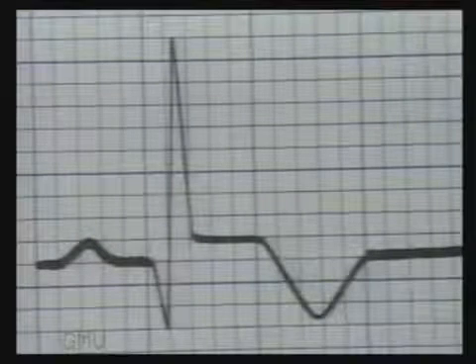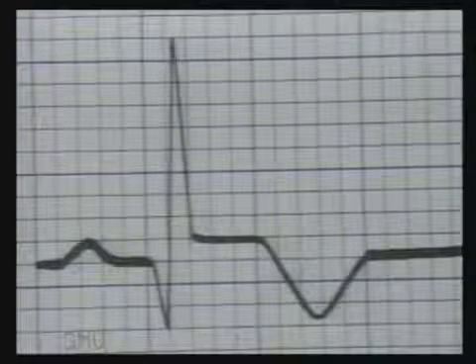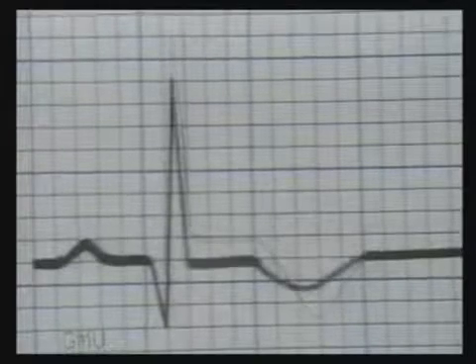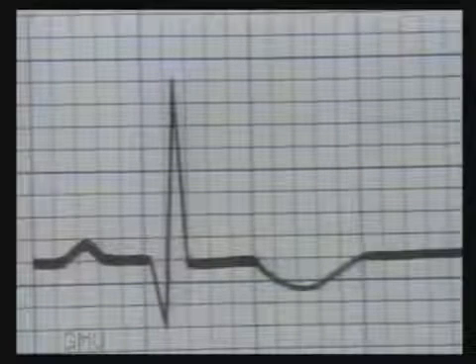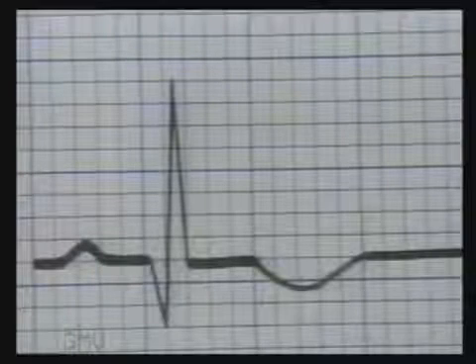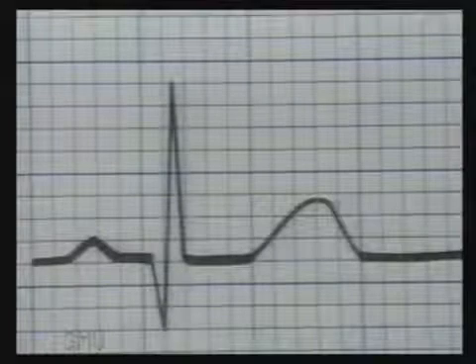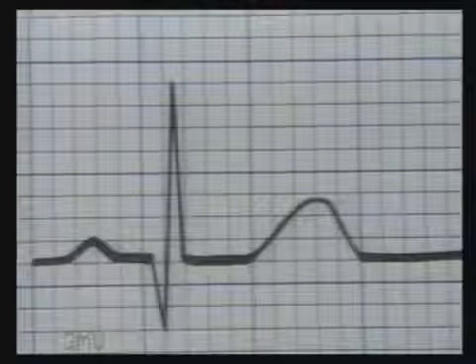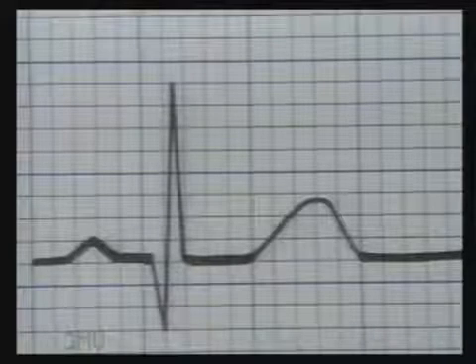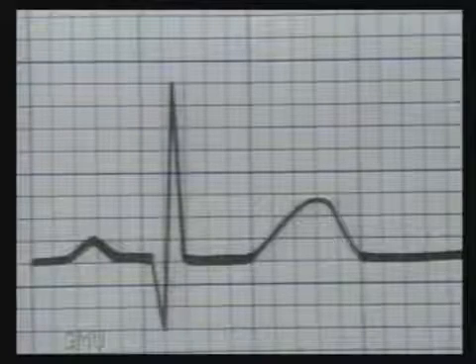The T wave is typically pointed and inverted with symmetrical limbs. In the third week, the Q wave will become fully developed and the T wave will gradually become flat and start returning to normal. By the end of the 3 months, the ST segment and T wave will return to normal and only the Q wave will remain permanent. Of course, if the size of the infarct is very small, the Q wave may completely disappear.